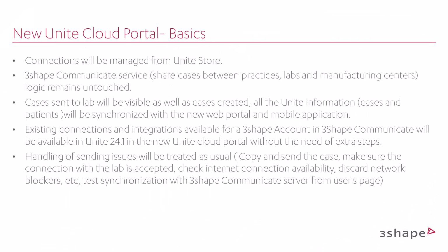In the new Unite Cloud portal, basic connections will be managed from the Unite store. The 3Shape Communicate service, which facilitates case sharing between practices, labs, and manufacturing centers, remains unchanged. The process of finding and connecting to a lab will remain the same in the backend, ensuring end users have a consistent experience using the Unite store.